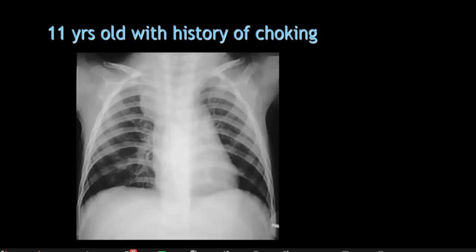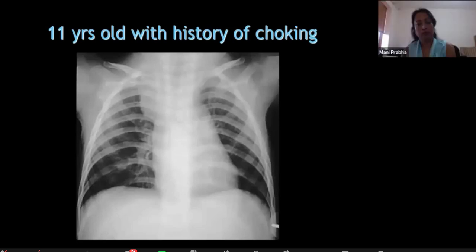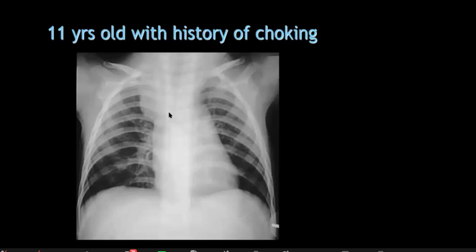I would consider first of all ultrasound scan, but obviously ultrasound wouldn't cover the retrosternal area. But I would begin with ultrasound scan. The patient may need a CT scan as well. See, on X-ray, there is no shift of mediastinum. The trachea is absolutely central, and there is a lesion which shows a very well circumscribed outline. Looks like a cyst. So what it can be?